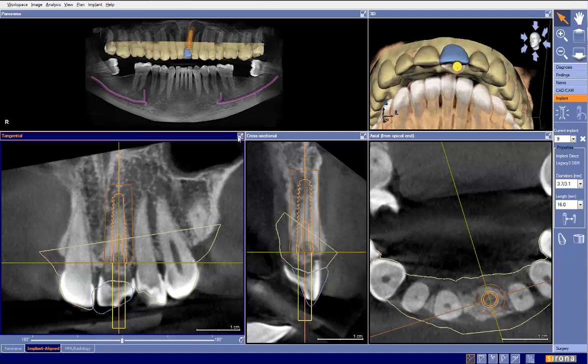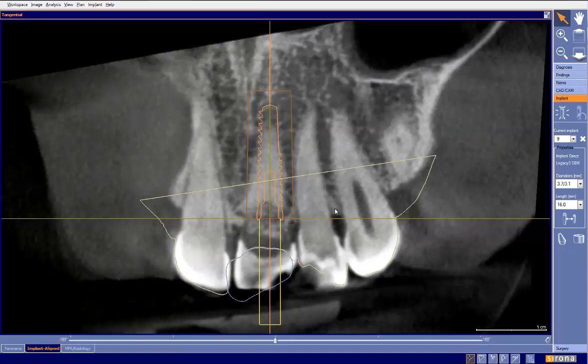So how do we determine that? What I would like to do is leave this plan here and let's just assume the implant is a good implant, it's the ideal placement, everything's perfect, but this is our plan. So let's take a peek here and we'll do a magenta line around the existing root. And there's the crown.